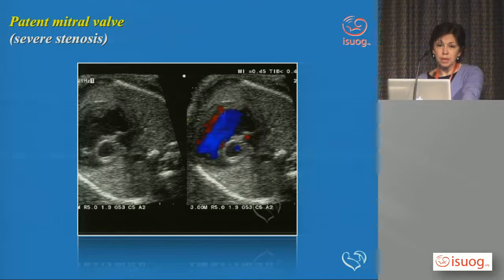Now, this is a different case where we had a left ventricle that looks like one of the specimens I'd shown you. Again, that image at this gestation looks highly abnormal. If this was seen 5 weeks earlier, maybe that difference between the left ventricle and the right ventricle wouldn't have been so great, and you still have an abnormal contractility. You would still probably have more echogenicity. So there are lots of signs to tell. It's not just the size of the ventricle.